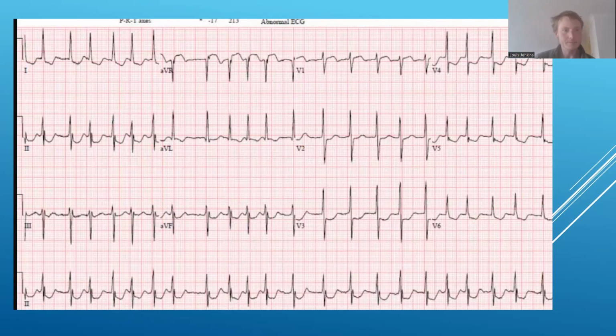Okay, so looking at the first impression, things seem off. The main thing that seems off is this is irregular, which should prompt you to look for P waves, and I do, and I don't see any. So irregular rhythm, no P waves. I'll give you 3 seconds to come up with a rhythm. 2, 1. Atrial fibrillation, or rapid atrial fibrillation in this case.